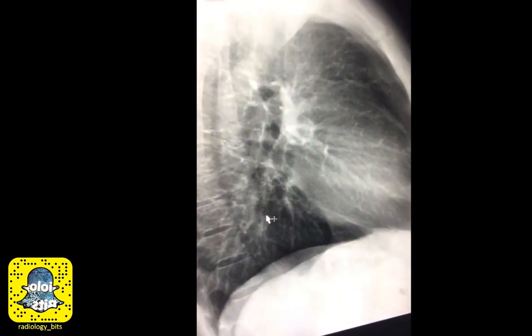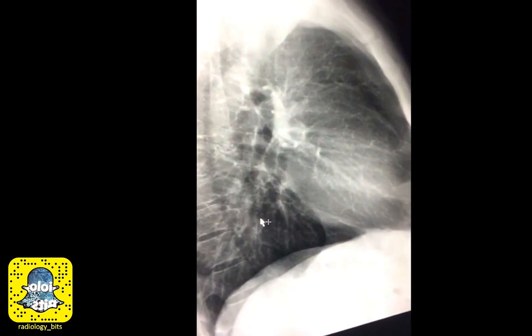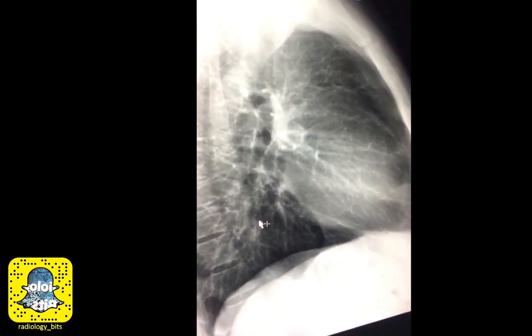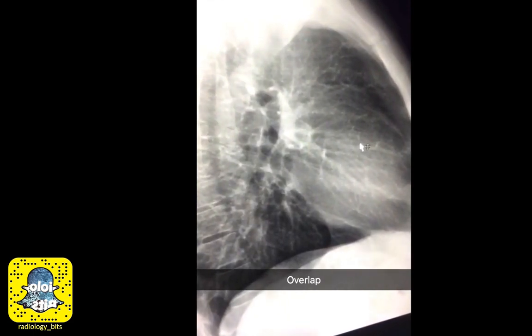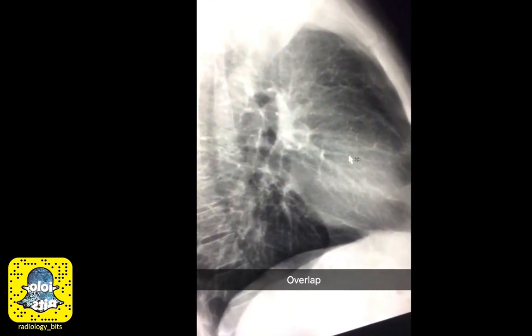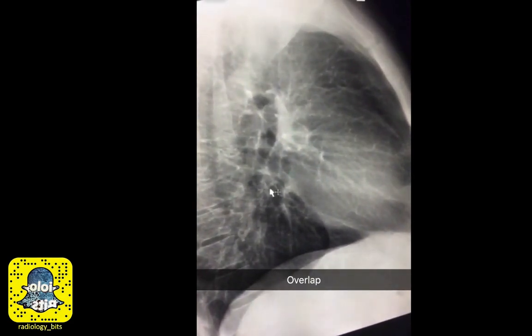As you have noticed, these are all imaginary lines. They do not delineate real anatomical boundaries between these compartments within the chest. You have to also keep in mind that pathology in one compartment could overlap with another. For example, an anterior mediastinal lesion extending to the middle mediastinum.